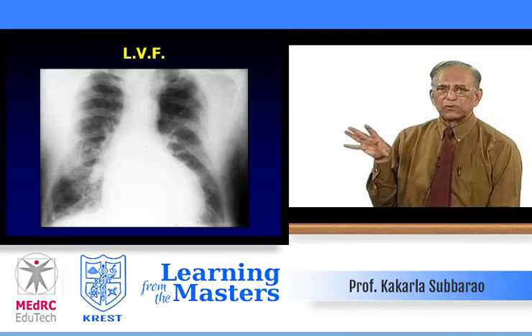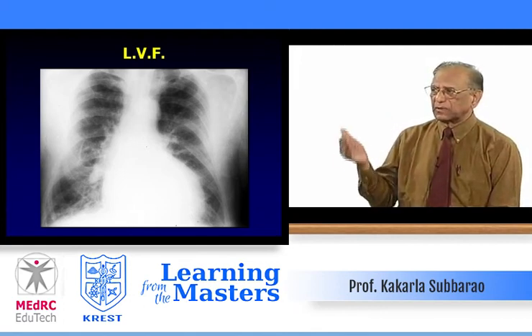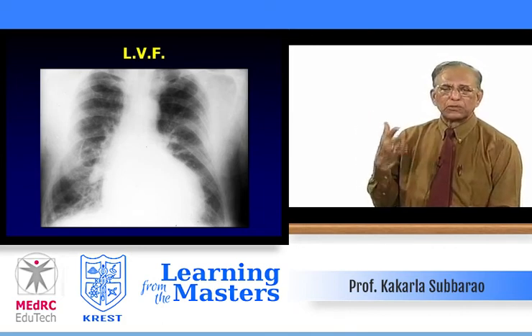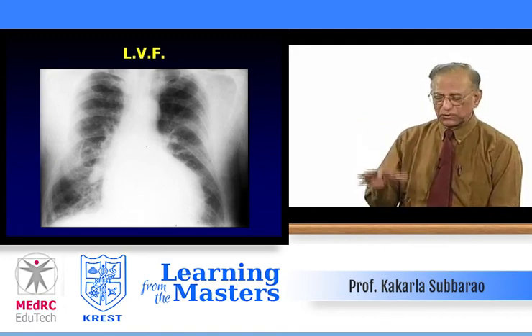Common, almost every day, a patient in a cardiac ward, left ventricular failure due to hypertension, left ventricle is prominent like pushed heart, and interstitial edema. To begin with, it is interstitial edema. Eventually, it may go to alveolar type of edema and pleural effusions too.